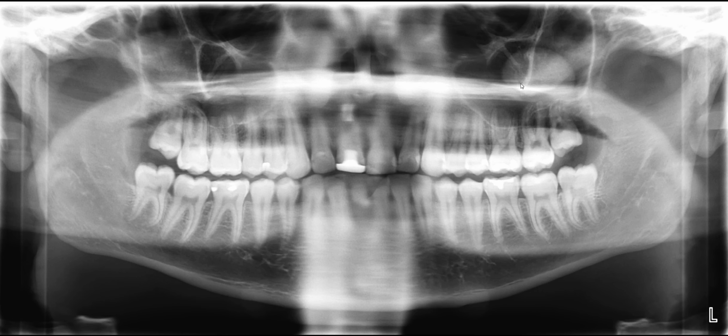Keep in mind this opaque area is not part of the lesion or this entity, but again, this is part of the zygomatic process of the maxilla, which is normal anatomy. What I want you to determine is whether this opacity has a density of bone or soft tissue. And what would you say that it is?